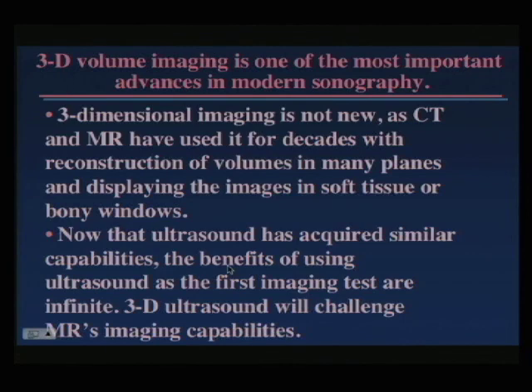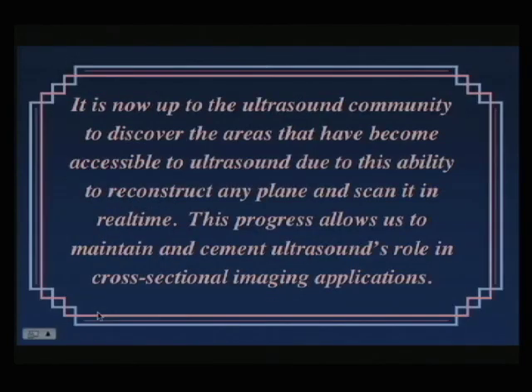It's going to put ultrasound back in the forefront of cross-sectional imaging. And the type of displays that we can get with this technique are infinite. I think 3D ultrasound will challenge MR's imaging capability.